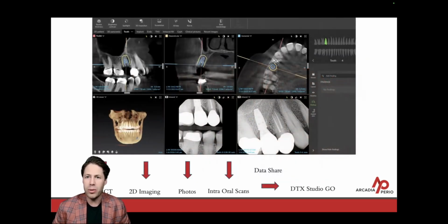So, this is the data viewing software. What this data allows me to do is blend or merge those two file types you just saw. I'm able to overlay the three-dimensional image with the three-dimensional scan. Here I'm able to see the soft tissue, the gum and bone, the teeth, the virtual teeth overlaid on top of the radiographic 3D imaging. From here, I'm able to start planning that implant process. So I want to walk you along in terms of how quick and how predictable implant placement can be when using the software.